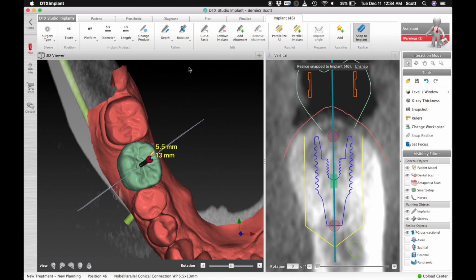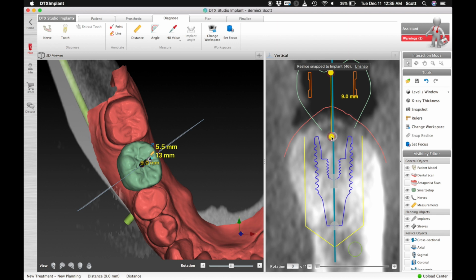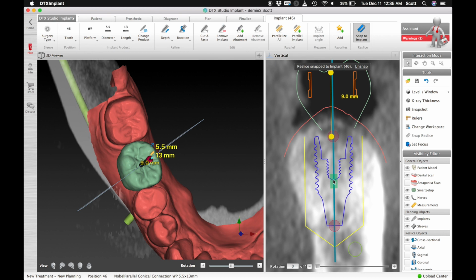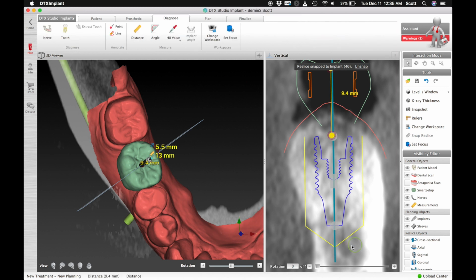But we don't have to do that on this case, so here we move that back, and we'll remove the abutment, because it's just confusing, because we're going to nail it with putting the implant in a great position. Now I'm going to also check the depth from my occlusion, down to the implant. So I'd like to have that a little bit deeper, because the deeper it goes, then it makes it so that this shape is going to be better, like a wine glass. It's going to have better emergence, so less food trap. So in here, what we would do is make this implant go a little deeper. So we click on the implant, we can go to the depth and push it down a little bit, like that. So I'm below the bone, and we're going to be below the bone today.